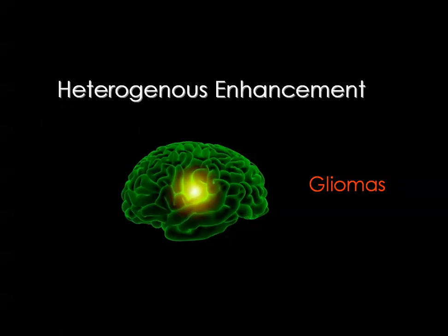Then we have finished the first category of brain tumors showing homogeneous pattern of contrast enhancement in the supratentorial area, and we mentioned that by far the most common lesion is the meningioma, the second lesion is the hemangiopericytoma, and the third one is the lymphoma. And we have described in detail the diagnostic imaging findings in each of these lesions.